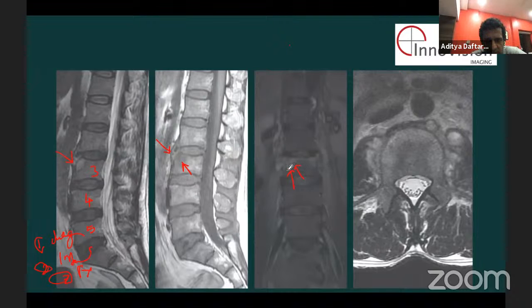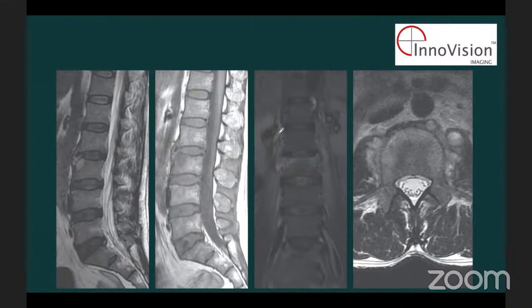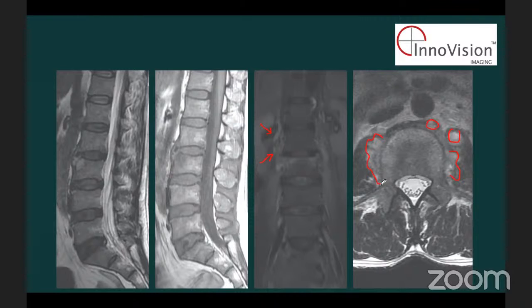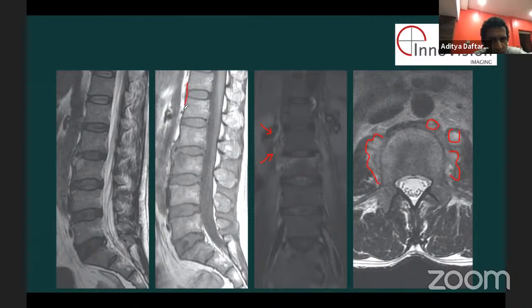When you look at this a little bit, you see there's edema in the end plate here, but you look a little bit to the side and you see what is all this stuff over here, right? This is all extra stuff that shouldn't be here, correct? Yes, sir. So this is stuff that you start to wonder about. Then you start looking at these axial images and you see that same level of the vertebral body, you see these little round fellows over here. Right? And you see this little round stuff here, and you see this little round stuff here. And then what would you think about? Maybe an abscess. Yeah, and then you start to look over here and you say, wait a minute, this anterior longitudinal ligament comes, okay. And then what is this one doing over here? And then this one becomes okay again.